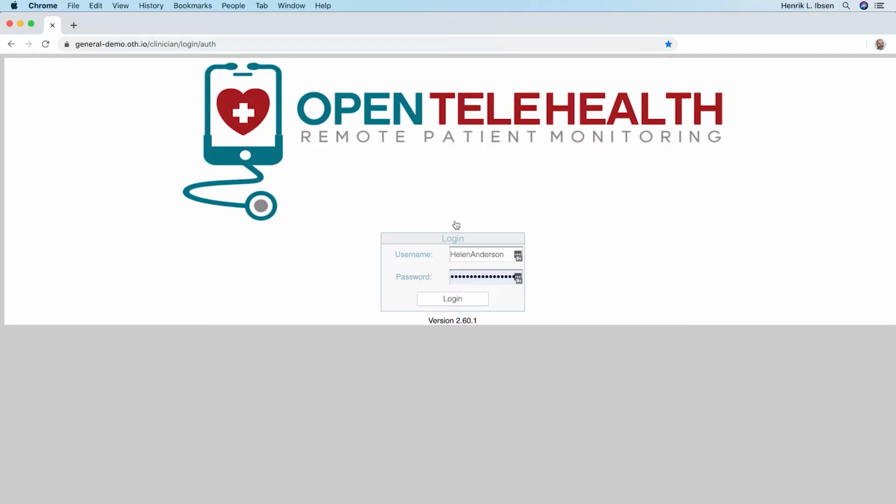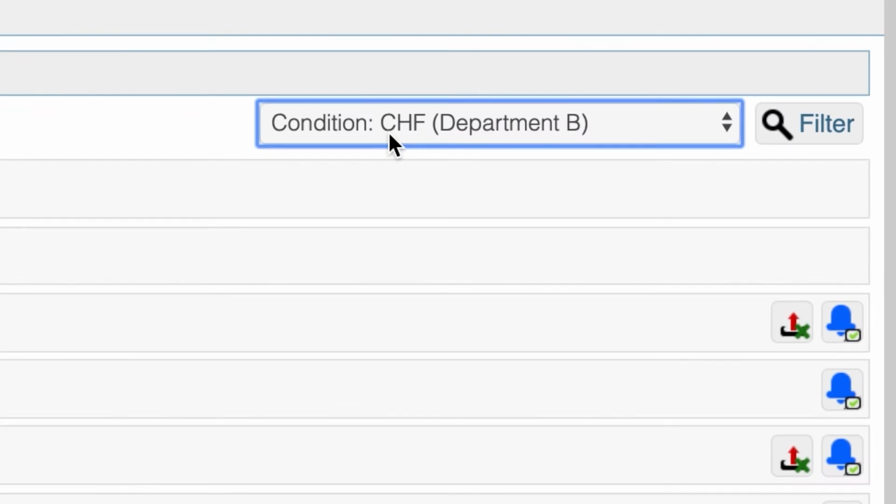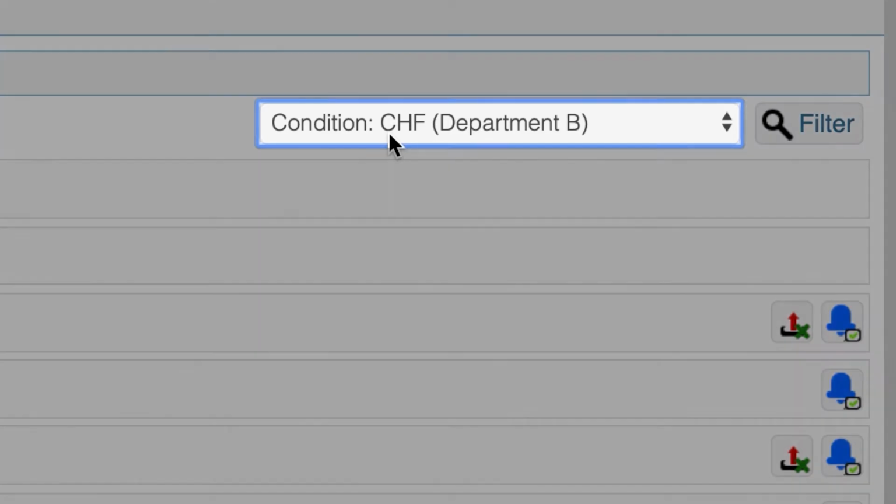Hi, today I'm going to talk about the clinicians, how they work in the system and how they process data, and how they generally operate the system from the call center point of view. So I've logged into the system as a nurse and I have access to my patient group. In this case, I am a nurse in the patient group for heart failure, which is called CHF, Department B.